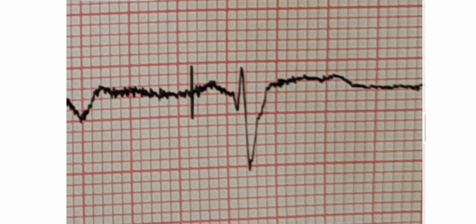Let's look at it again. After your P wave, you've got a small downward deflection, a smallish upward deflection, and then a very big downward deflection. Then it goes back again. It doesn't go back all the way, but it joins the rest of the line.